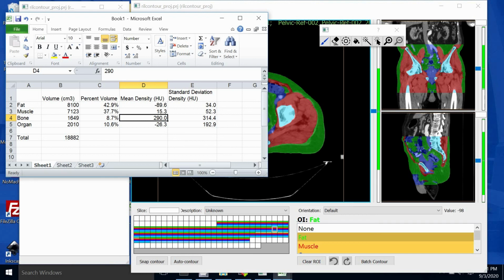So of course, the promise of AI is that we can do these segmentations automatically. Rather than doing the manual corrections ourselves, we can just run the algorithm on dozens or hundreds of scans at a time, generating not only population metrics, but patient-specific metrics that we can use to better tailor our treatments to our patients.